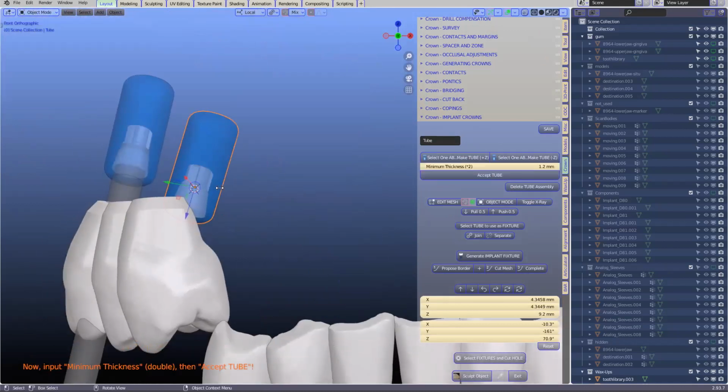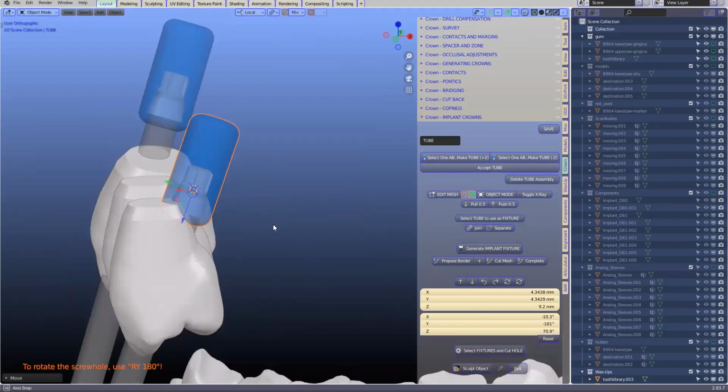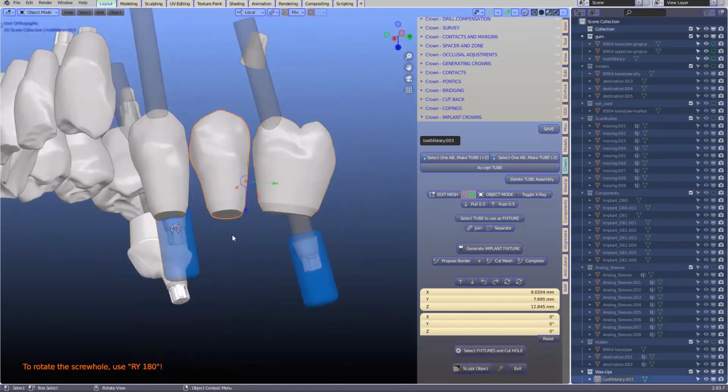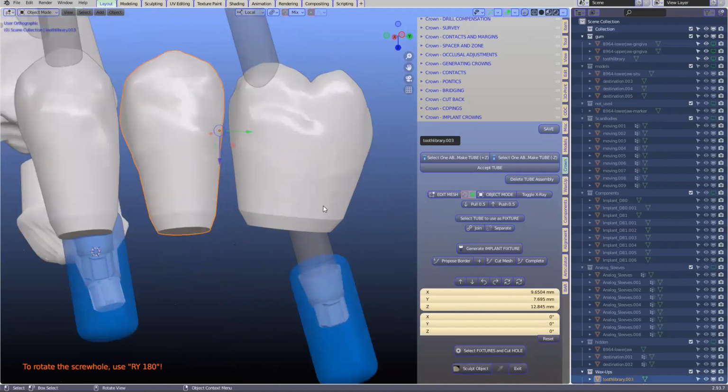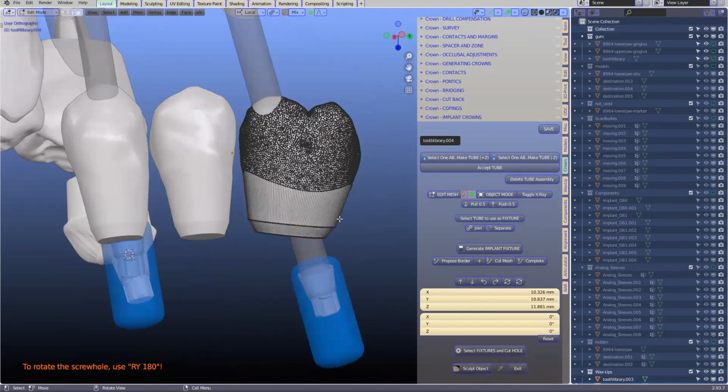Yeah, but we just try and keep it minimalistic. So don't do the whole thing. We want to focus on a few, make sure it works, and so on. Accept that, and I can just move it. Then what we're going to do is the same thing. So you're submerging the root, the apex of the tooth mesh onto the blue tube, correct? Exactly. At the moment, my tooth library is like that. It can work to your advantage because then you can just move these over here.